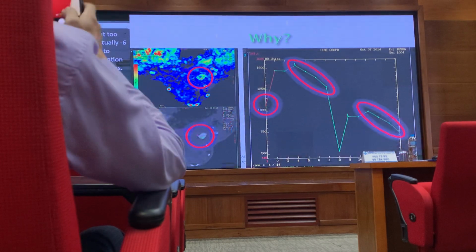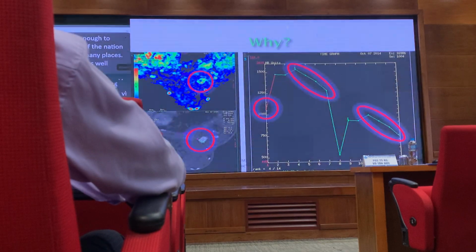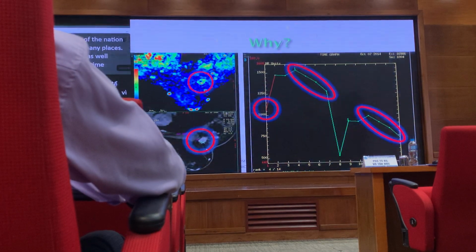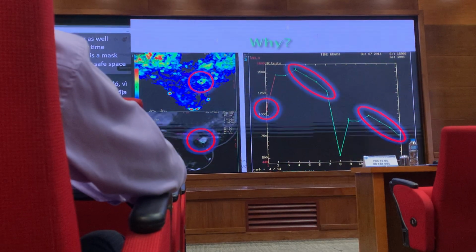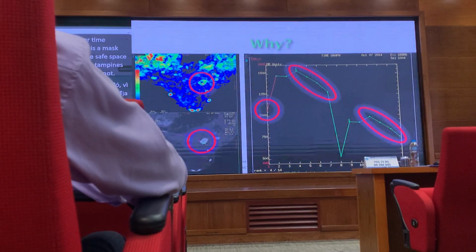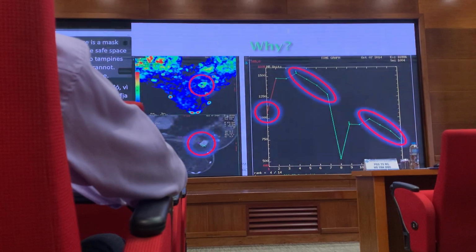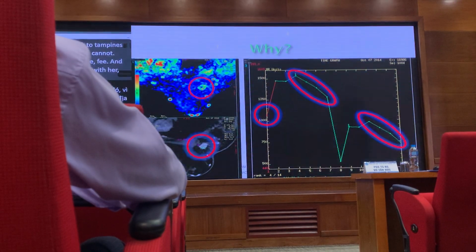And this one, same thing as well, because we put too long a time. Eventually, the first phase is the mask, and then followed by the 6th phase, we can see the washout to determine. But anyhow, with MRI, we cannot decide directly whether the cell is benign or malignant. We always complement with maybe ultrasound, mammogram, or biopsy.